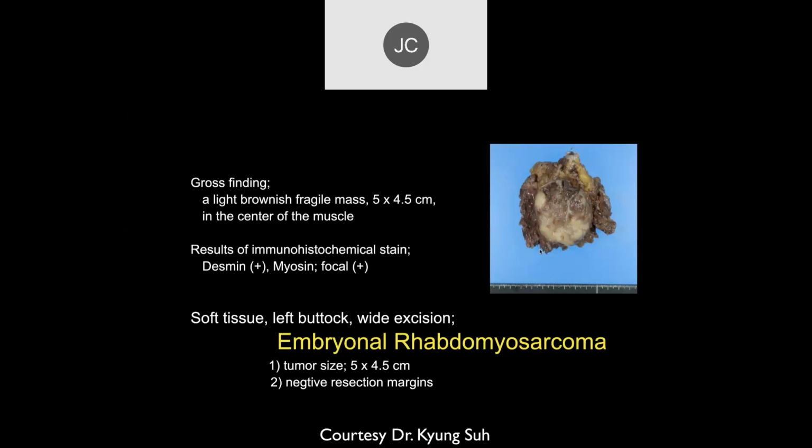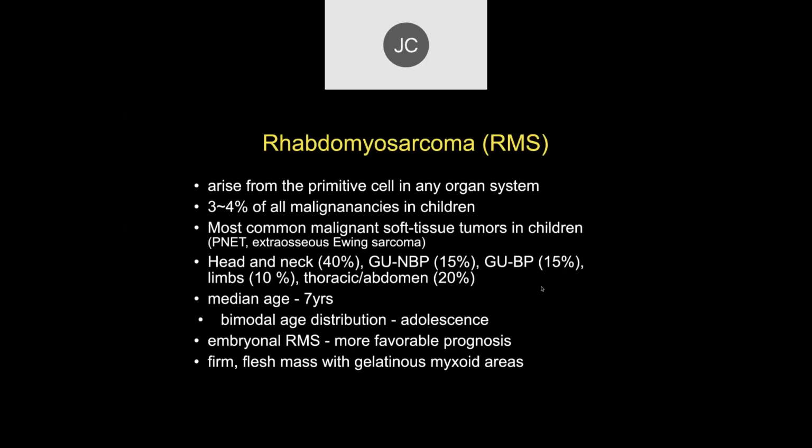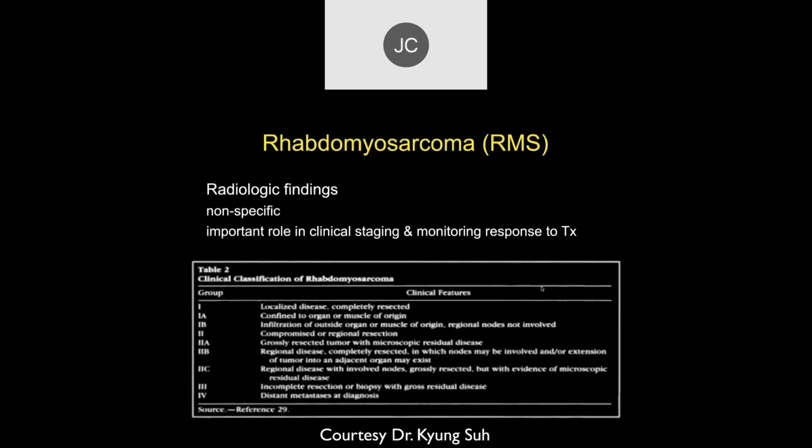Yeah, in kids, these kinds of masses tend to be, unfortunately, malignant. And here we can see that there are a few little mets, which these things like to do. They tend to occur in young kids. These are very aggressive.